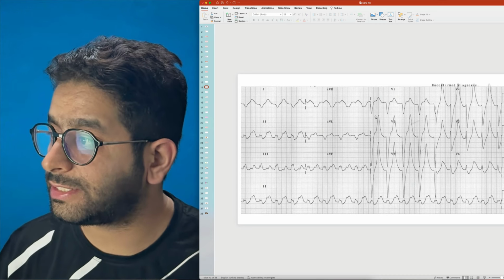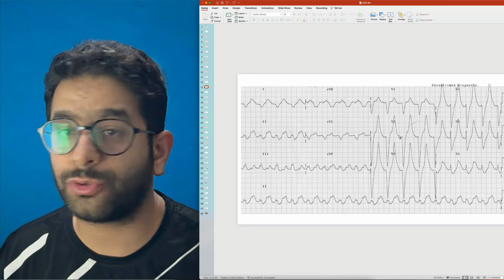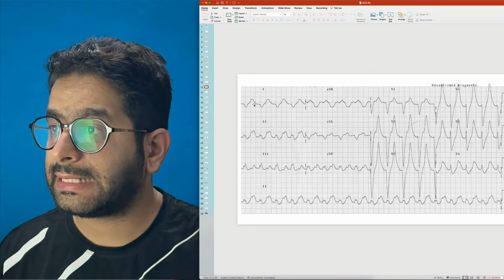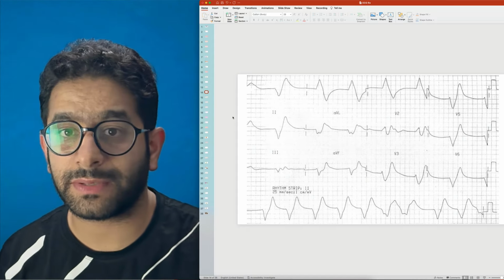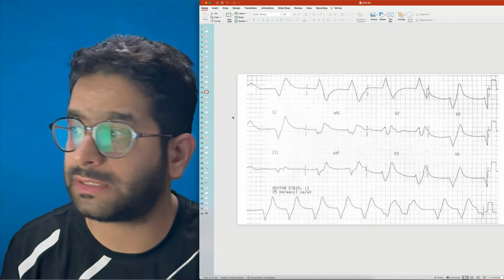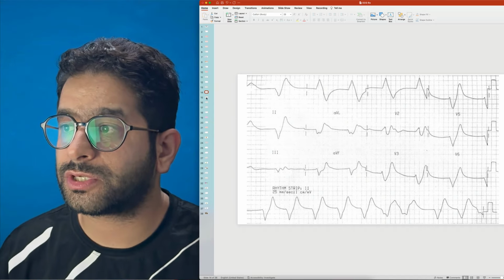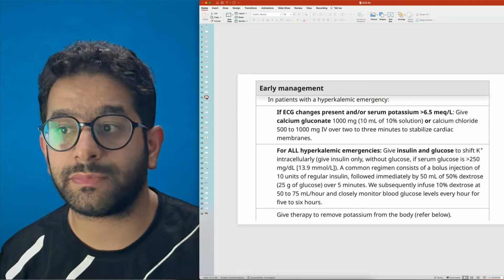Then I showed you this ECG where you had to identify these tall and peaked T waves. I told you this is hyperkalemia. Even the QRS has broadened out, okay? Then with further elevation of serum potassium levels, I told you the QRS becomes really bizarre. The QRS is stretched out. The QRS is widened and bizarre, P waves disappear, T waves are tall and peaked, all gets merged together, and this predisposes to dangerous ventricular rhythms, and the patient can die unless you stabilize this patient by treating hyperkalemia.